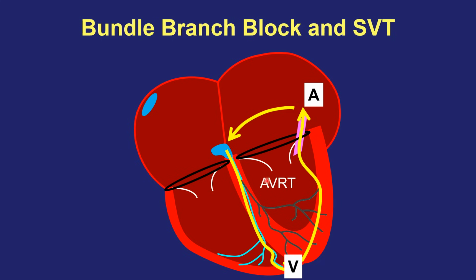Because in this case, when you initially, without the bundle branch block, activated ventricular tissue, it's the shortest route that's going to be followed. So the closest Purkinje fiber to the pathway is going to be responsible for getting the signal up to the pathway the fastest. And if you developed that bundle branch block, you can again still get to ventricular muscle, but it's further away from the pathway.